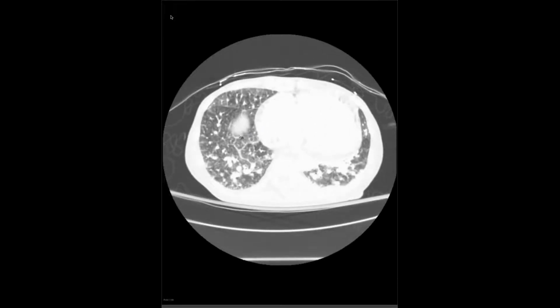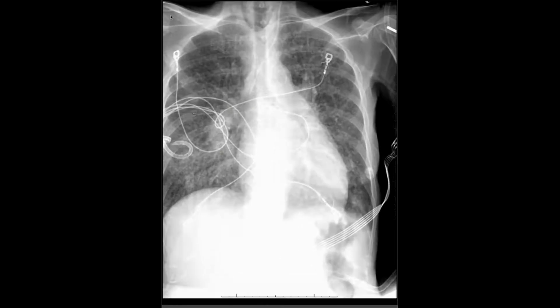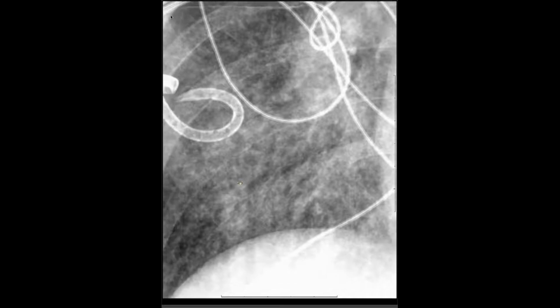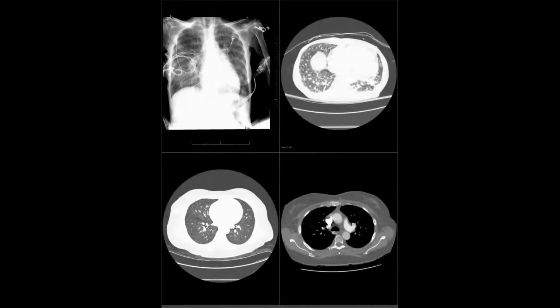I think it's harder to see with all the florid edema she has there, but this is her most recent radiograph. I think some of these look more nodular to me than thickened interlobular septae. So I was wondering, when you guys see something like this, at what point do you raise the suspicion of PVOD or PCH?